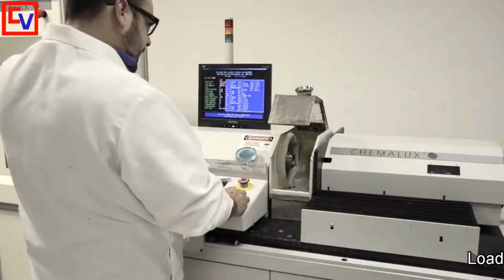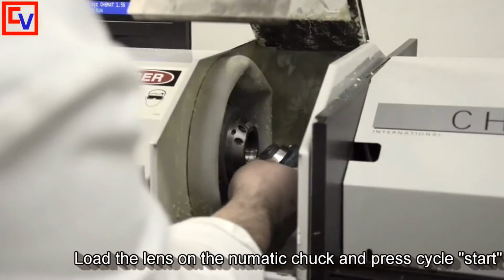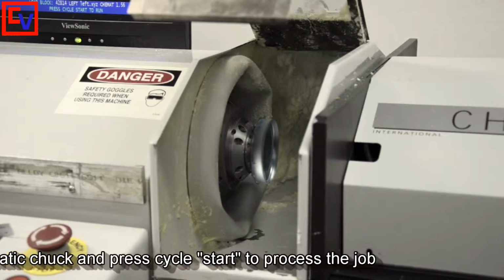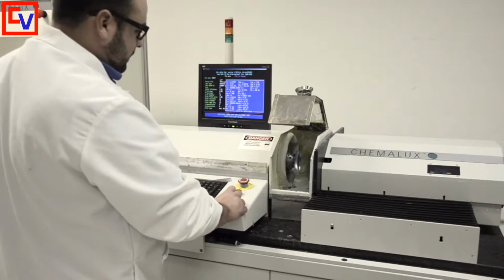With all the information calculated and you're ready to run your job, you would go ahead and chuck your lens into the chuck, bifocal down, and once you have that, then you go ahead and hit cycle start, and then you would start the job.